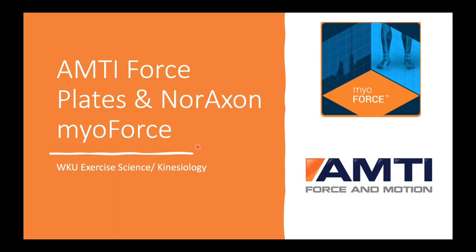We're going to learn how to use the AMTI force plates that are located in the biomechanics lab, as well as use the NorAxon MyoForce software to interpret the data that we get from the force plates. The main thing we're interested in today is calculating countermovement or vertical jump height, depending on whatever you're interested in. This will allow you to receive data that you can use for either a study or a class purpose.